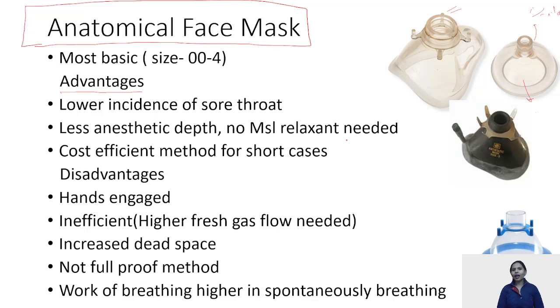Now the star or the most important part of these masks is the dead space. The dead space is increased in the mask. And what is the dead space of the mask? This whole area of the mask forms the dead space, because if you can imagine, this is the area which is filled with gas, but there are no blood vessels. So this forms the dead space of the mask. And this is equal to the volume of this mask.